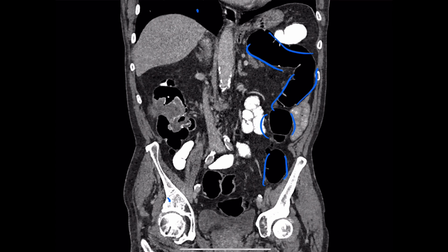Now, your expert eyes have honed in straight on the pathology, but will you point out a few surrounding structures for us? Okay, so liver, right upper quadrant. You've got the right hip, left hip. We've got catching a little bit of the aorta, and there's a little bit of calcification there. My psoas is not here. Not well. As we're catching a little bit of psoas there, the scan will go in and out of plane.